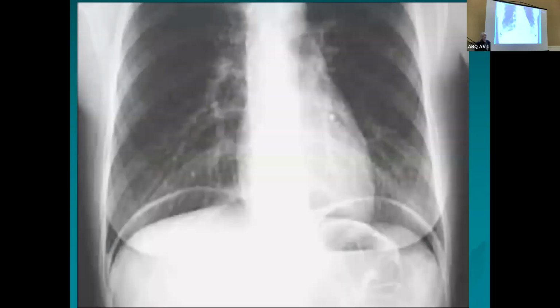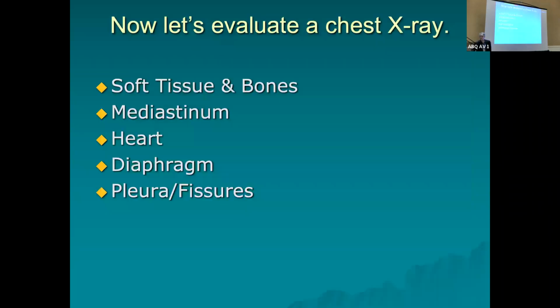But if I'm ever looking at a chest x-ray for someone who's got abdominal pain or abdominal discomfort, I want to look to see, is there air underneath the diaphragm, which this person has right here. This is a perforated bowel where they have air that's escaping out into the system. So they've got air right in through here. Okay, so that's air underneath. You can see the liver, stomach area right through here, and air being trapped.